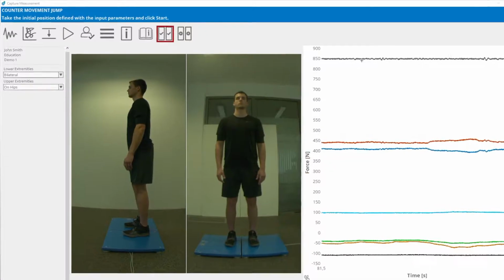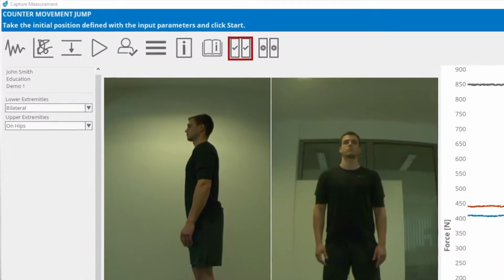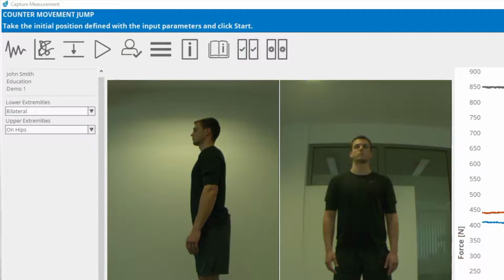Test Device will show you all the raw signals for the selected device from all plates. This utility is used to check if all signals are correct. If you want to change the range of the plate, you can change it by clicking on the Set Plate Range button.